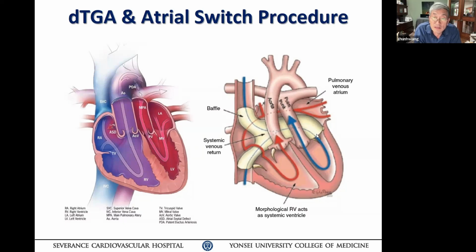And your pulmonary venous drainage is very passive. So the left atrium seldom has truly good contractile function when you do a Mustard or Senning procedure. So the dominant P wave you will see is mostly from the right atrial sinus rhythm activity. That looks like what we used to call half a P wave.